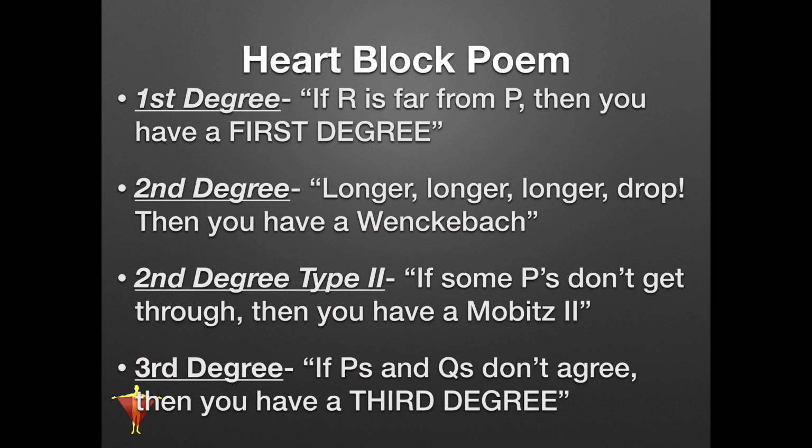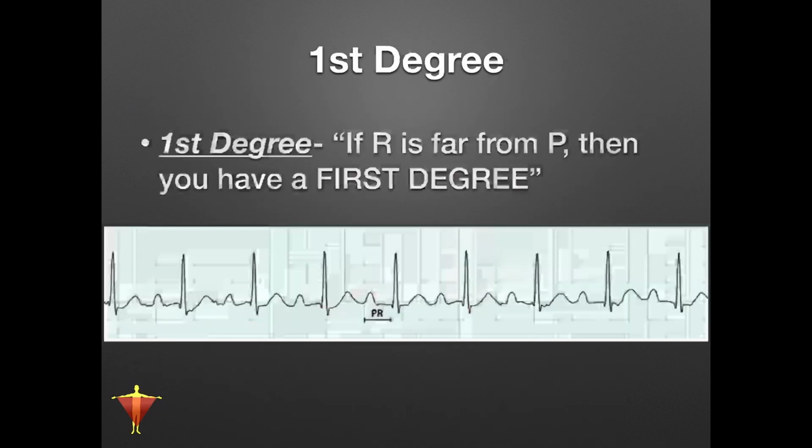The top part of the heart is not talking to the bottom of the heart. So that's what we would identify as a third degree. So let's take a look at these.